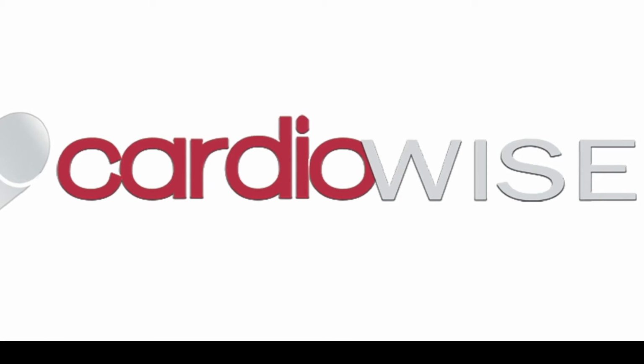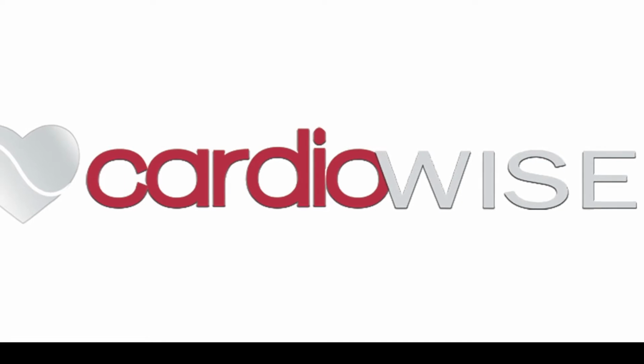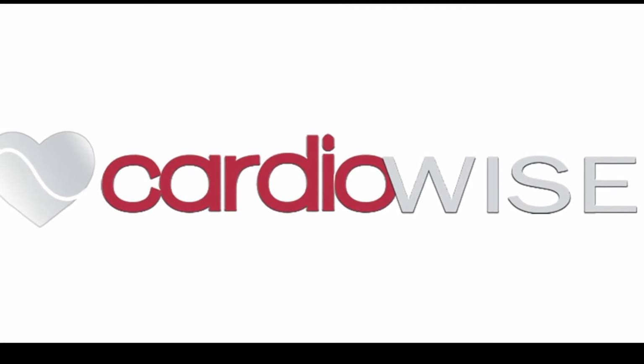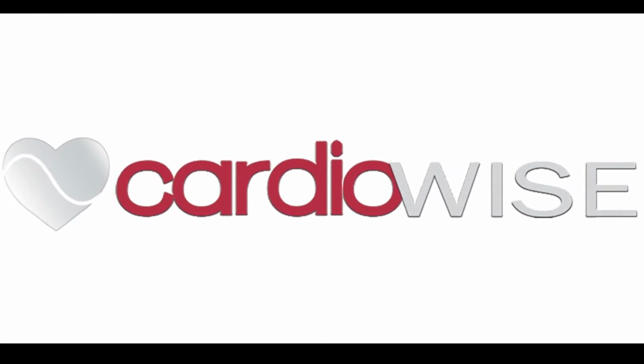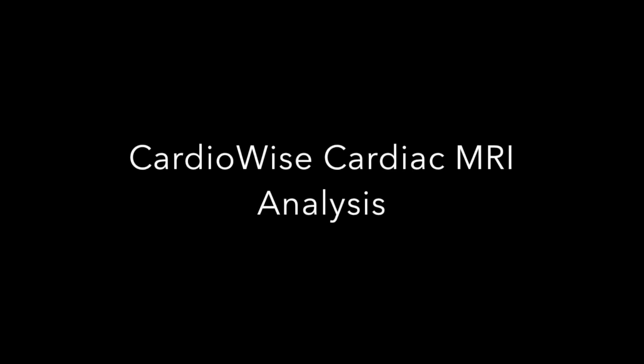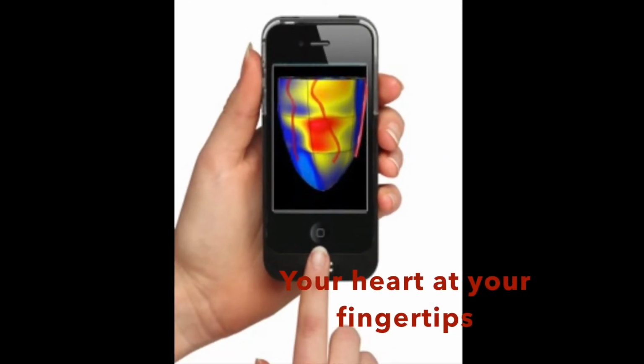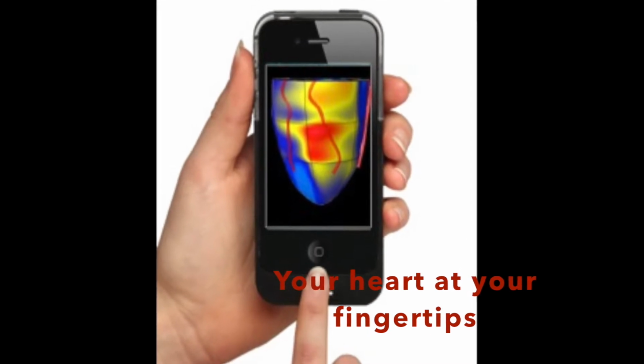CardioWise is a cardiac imaging and software analysis company that simplifies the diagnosis of cardiovascular disease and sets new standards of cardiac care that will reduce the cost of healthcare. Our first product, CardioWise Cardiac MRI Analysis, is available to caregivers and patients so that they can participate in decisions about their care.